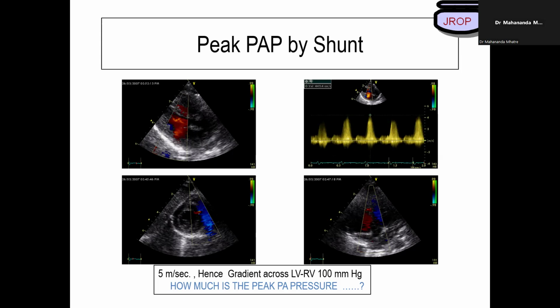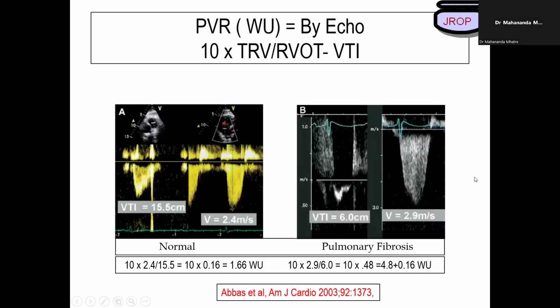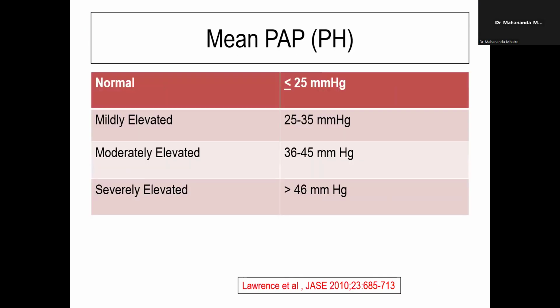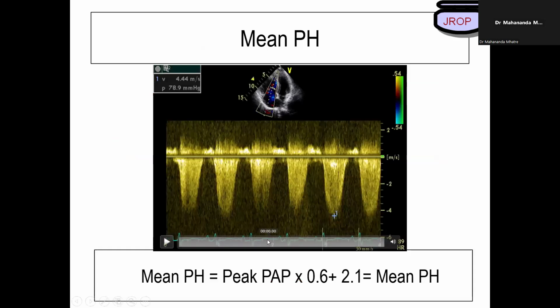One more important thing when we talk of pulmonary artery hypertension. Let me just show you that slide. It's a very important phenomenon and we always overestimate our pulmonary artery hypertension. Look inside. The peak is over here and you can see a peak over here also.